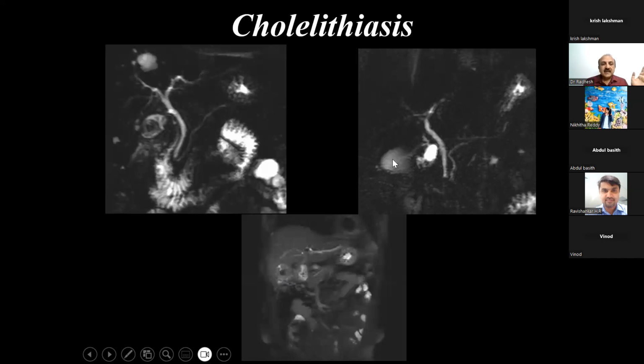So whenever you start seeing the MRCP images, suppose you don't see a filling defect, it does not mean there is no calculus. So always look at the raw data like the radiologists, especially the young surgeons. Do not look at the images which look so beautiful. There is so much hidden inside. The same thing happens when you open up: you will see the gallbladder, and say there is nothing, but then we find a polyp or a tumor inside. It's only when you dissect that you start seeing. Similarly in MRCP, with smaller, thinner images, you will pick up the lesions better.